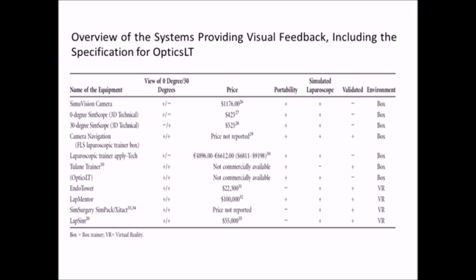The first uses a system called camera navigation, which permits views of 0 and 30 degrees, but it cannot be used with other training systems. The second uses a camera called 30 degrees SimScope, which only provides views at 30 degrees. The Simulab trainer has a camera called SimuVision, but this only provides views at 0 degrees. A comparison of these systems is shown in the table, with the FLS system highlighted since it allows evaluation of manual skills using the FLS modules.